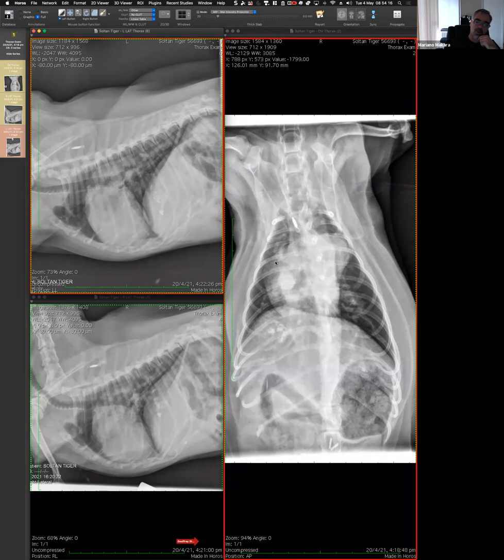But to learn more about that anatomy, probably comparing this with CT, I'll try to find a CT and try to have this same view, like a dorsal view, and see, like we did with the PDA, where we reconstructed the anatomy and the actual PDA, where it sits, and compare that with the radiograph. I think going back to the anatomy of the pulmonary arteries in a CT and then coming back to this image is going to help a lot to reconcile this image with the anatomy.